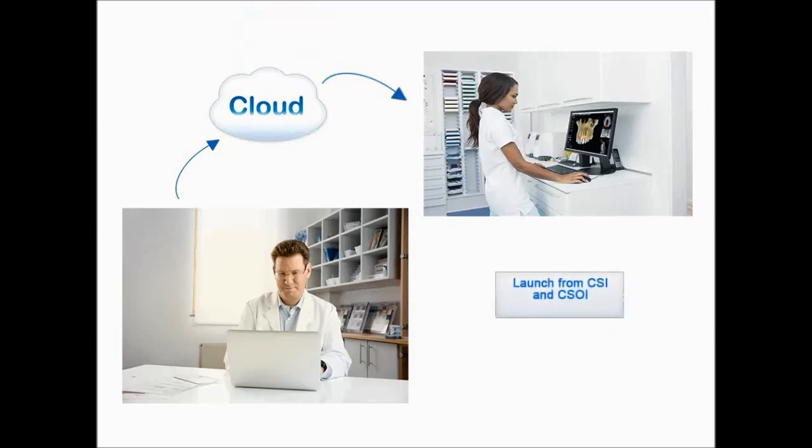CS Connect is integrated with Carestream dental imaging software, so there is no need to launch an additional software application. Doctor-lab communication is simplified with CS Connect's integrated online web form and custom forms created by the lab. These forms provide a standard for communication between your practice and the lab, reducing the risk of missing information.